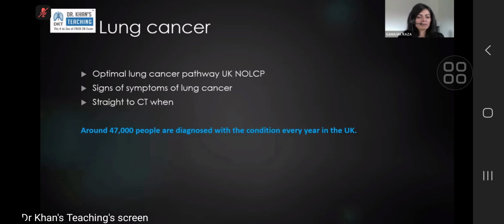That's why all the thoracic radiologists were trying to explain to people that you can't treat a CT scan in COVID patients. You can't treat an appearance on a CT scan, because the appearance on a CT scan today doesn't tell you what the patient is like today. If the patient is better today compared to a week ago, the CT scan will take slightly longer than that to reflect it. So yes, we can do a shorter interval follow-up, but those questions are generally different.